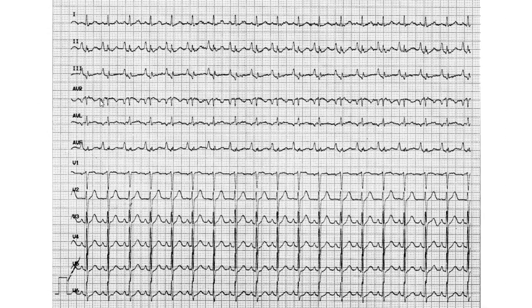Also measure the P wave, see if there's any pathology with it. You know the physiological ranges. So next you see the PQ and you check if it's normal, and you're all right, okay? And you measure the PQ because the P wave is normal, sinus rhythm, regular. I took this example for you so that you could see that sometimes tachycardia can trick you into thinking it's fibrillation or something. So yeah, I just wanted to highlight that.